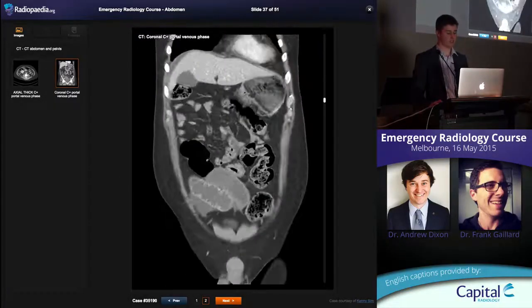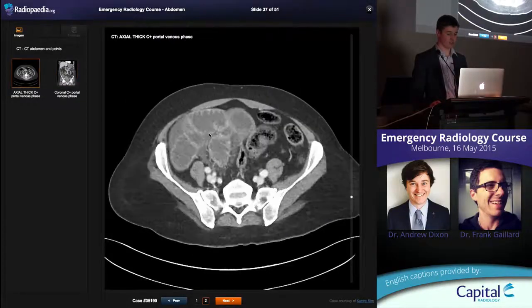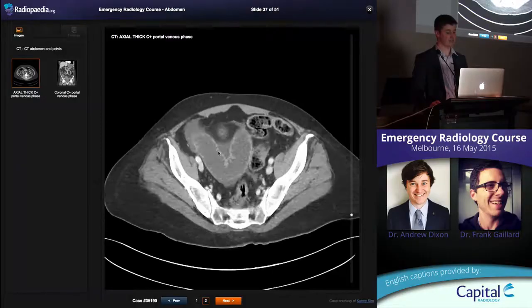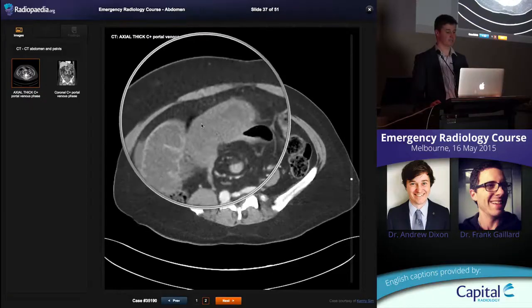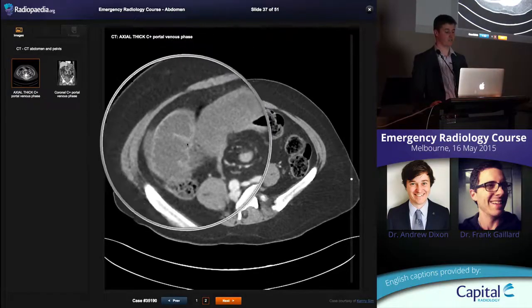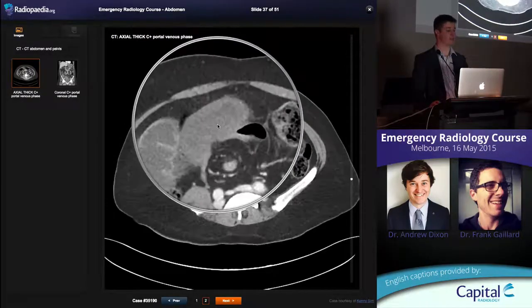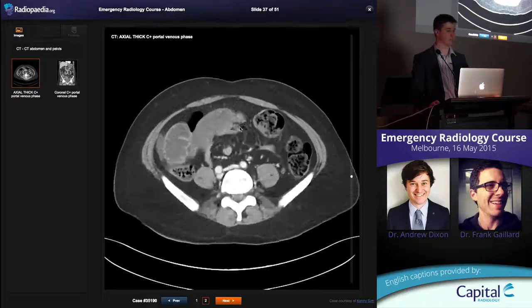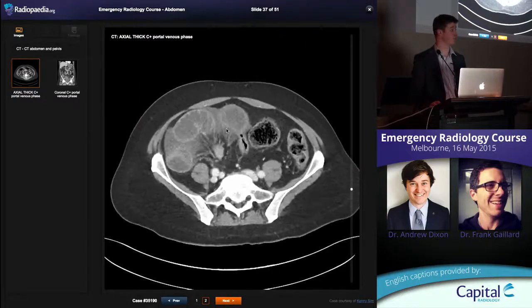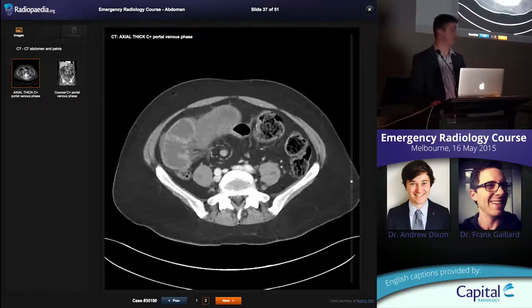Then you're looking at the mucosa of this patient. I'll do it on the axials. Looking at the mucosa, see the nice mucosal enhancement on all these loops coming around to here, and then suddenly can't see any mucosal enhancement. See that loop? Nice mucosal folds enhancing. So that's an ischemic portion of bowel, okay? So the fluid next to it is something that tells me, oh, this is not good, okay? It's not your standard small bowel obstruction, and then looking for the mucosal enhancement.